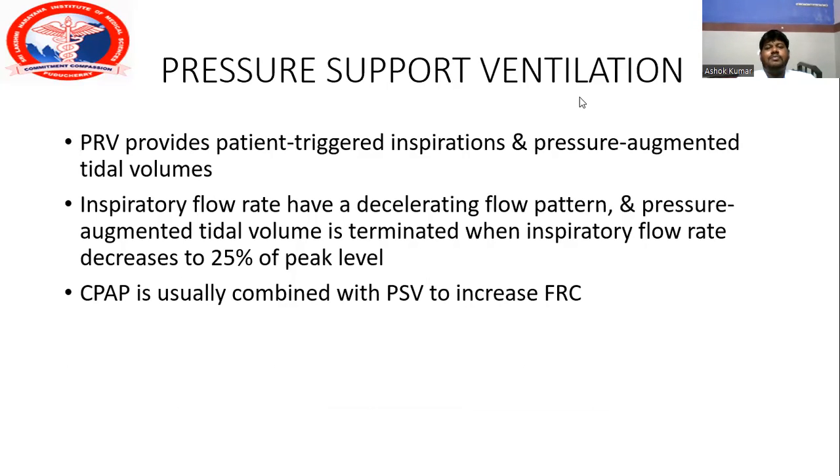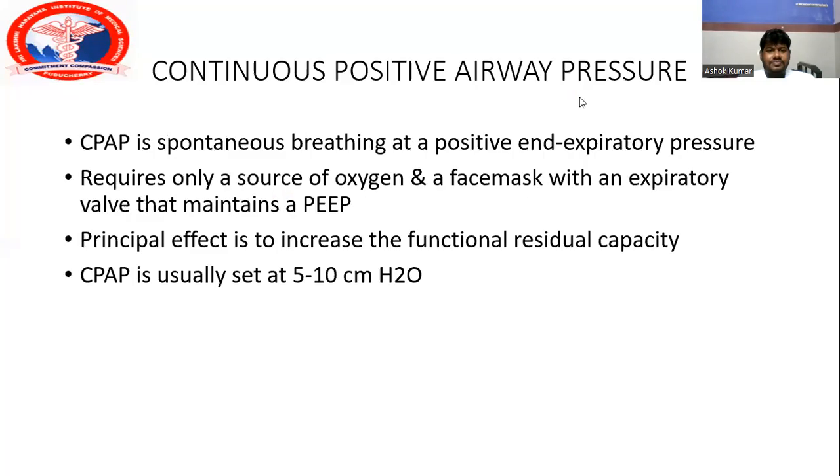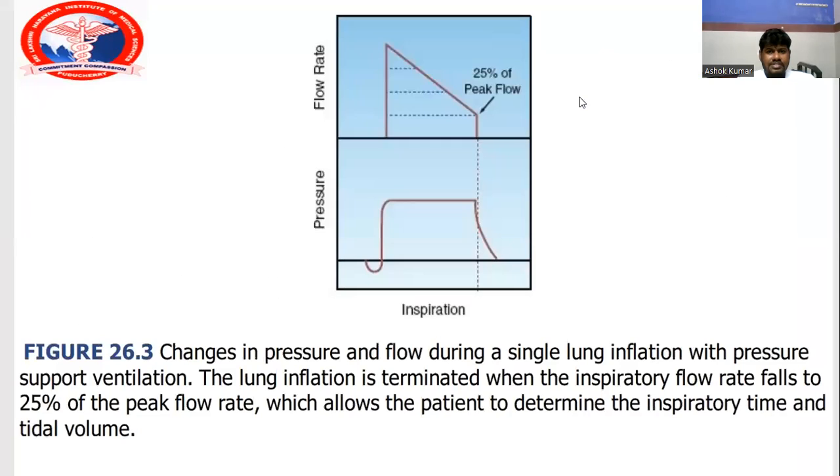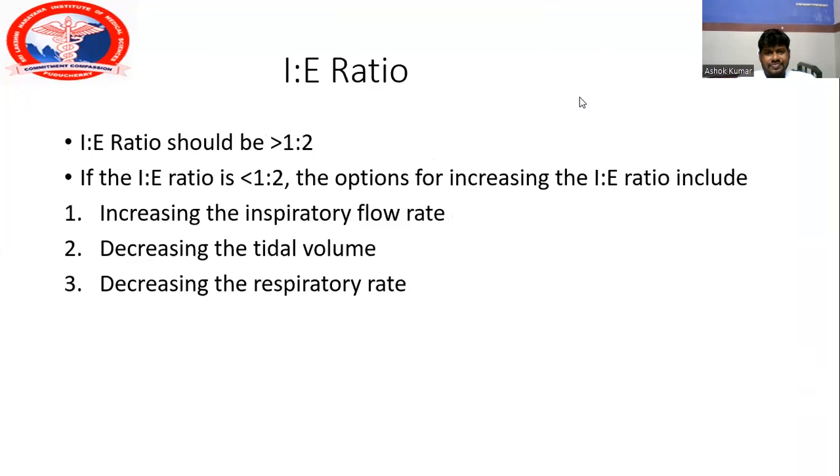I can show the image. In this image, the inspiratory flow rate suddenly increases and falls during inspiration. There will be a decelerating inspiratory flow rate. Once it reaches 25% of peak flow, it falls to zero.